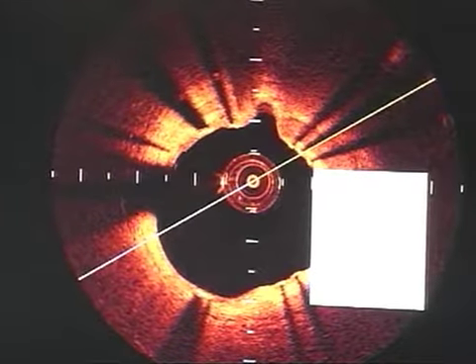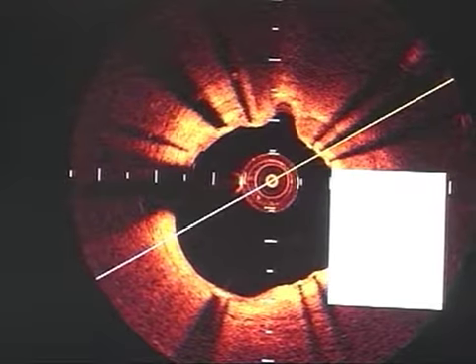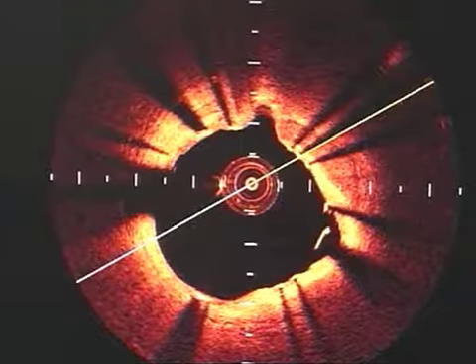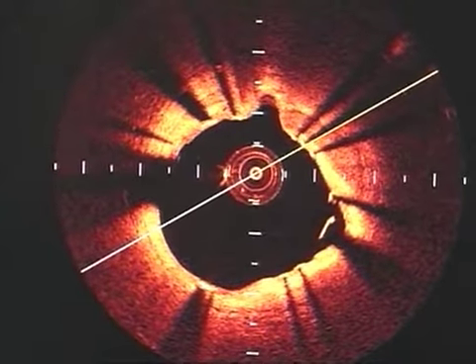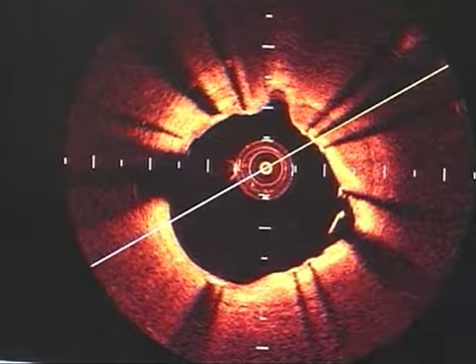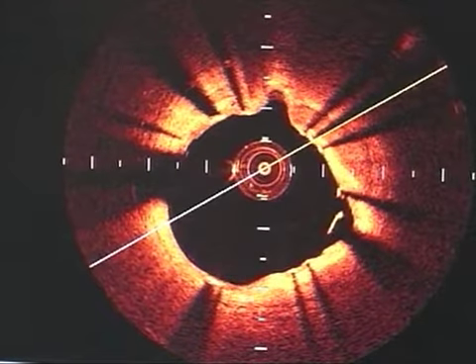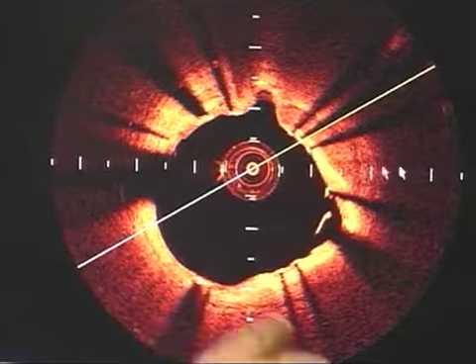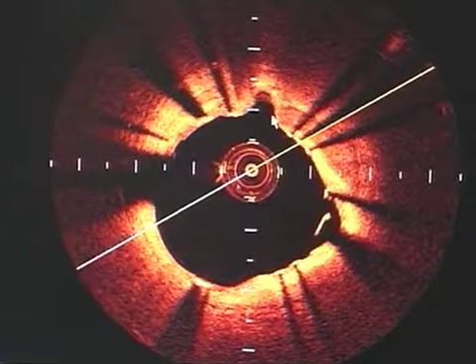I mean, you need to zoom it because a lot of work in the OCT is post-processing. Once you have acquired, then you do all these parameters. How do you zoom that? Magnify and see the intimal coverage. They say that if your stent coverage is like 65-75%, it's good enough that the stent has been covered by the endothelial layer, and it may be okay to stop the antiplatelet therapy in those rare cases.